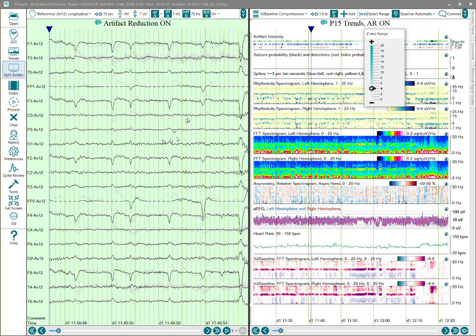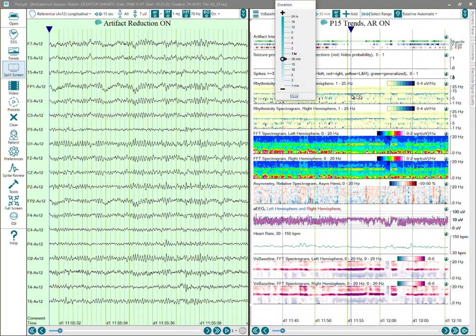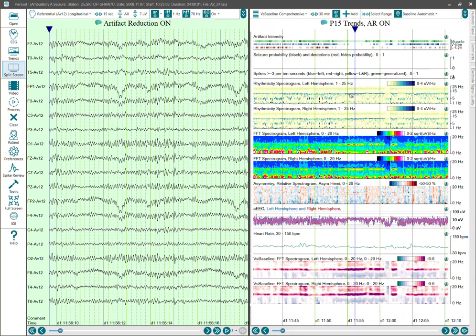And just like gain on an EEG, you can change gain on spectrograms. So as I turn this up and down, setting the threshold, the color range that's being used, I can set that so things are nicely visible. The default actually works very well because right here I can see I've got rhythmic activity, and I can zoom in a little further. We're looking at 1 hour. Let's go to 30 minutes on the trend. So it's bilateral, it's rhythmic, it's not evolving, it's alpha.